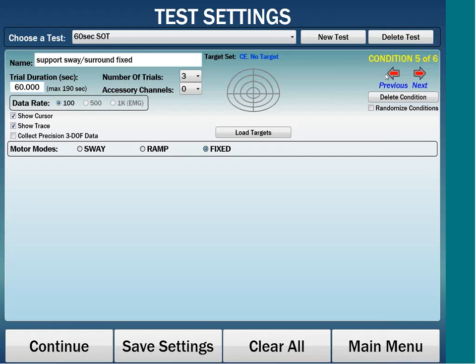The dynamic system provides 5 load cell data: left front, right rear, shear, left rear, and right front. In contrast to the CR system, which provides 2 independent force plates, each with 6 degrees of freedom. This is quite a lot less data, but it is still very usable data.